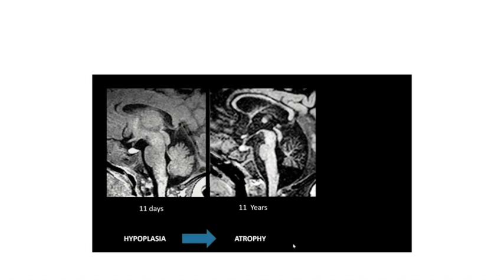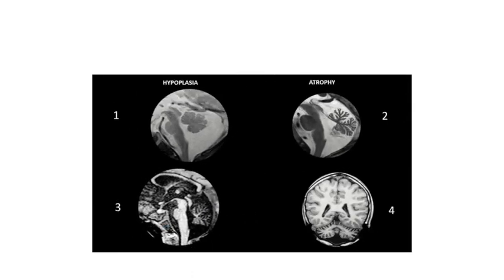So how does this happen? This is because of the prenatal onset of degenerative disorders. So because it is prenatal, the cerebellum is never allowed to reach its full growth potential. So it looks like hypoplasia to start with. But these are intrinsically degenerative disorders. So atrophy ensues over time and progresses. PCH and CDG are two classic examples of the spectrum. Let's move on to the fourth scenario.